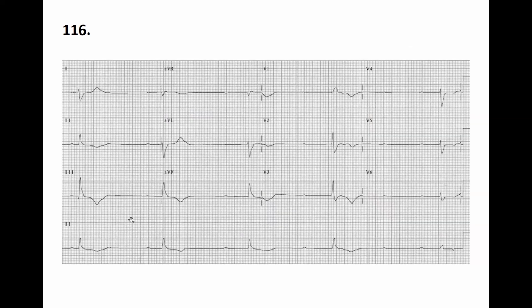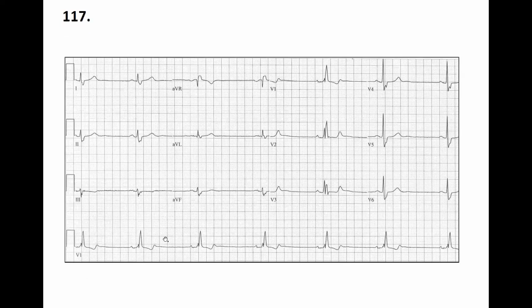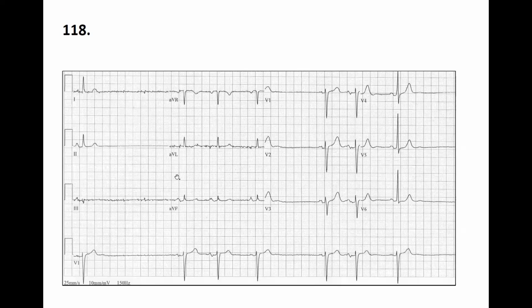116. Anybody? 117. Okay, that's bradycardia for sure. Later on, that's a conduction abnormality as well, so we don't need to discuss right now.